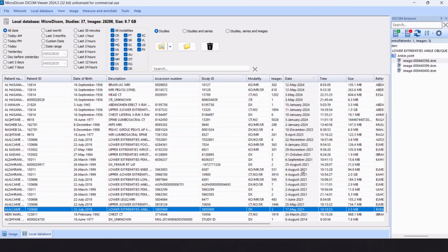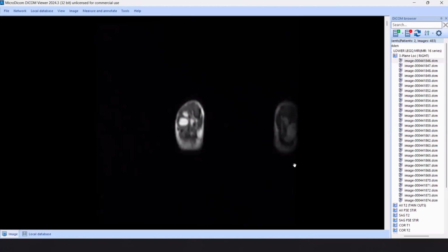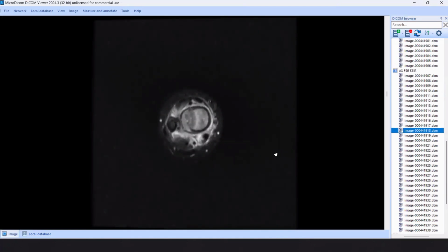What do you think? How can we justify or characterize this lesion? If we are suspecting that this one is not specific for something, I would like to do maybe CT, but because it's a young patient, I will do MRI to avoid the radiation. Okay. We did MRI for the patient 3 weeks after the X-ray.